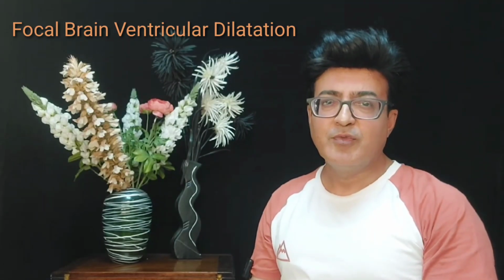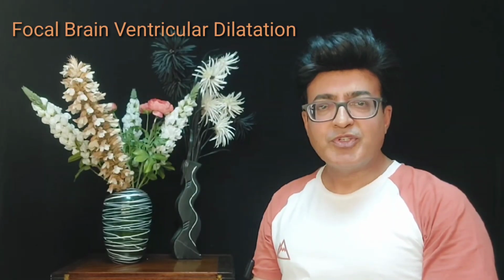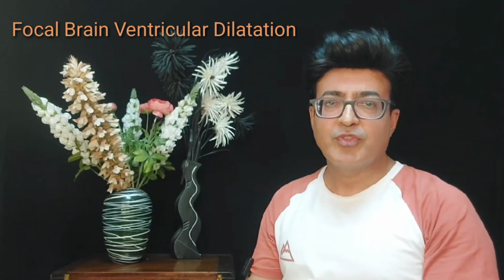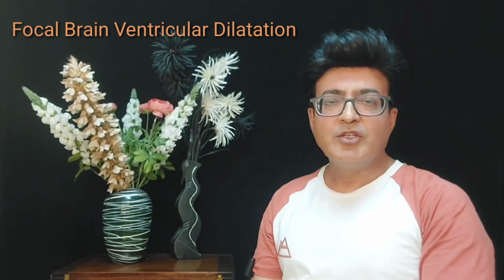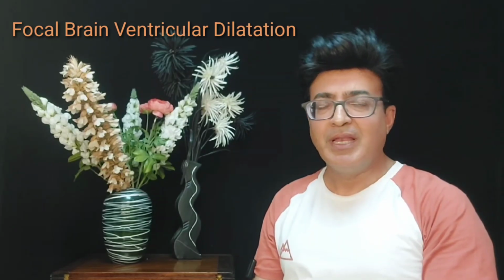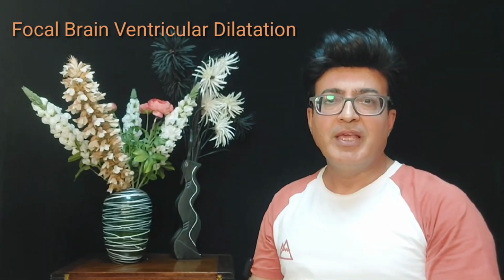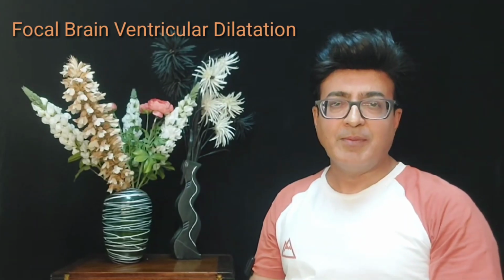In the pediatric setting, obstruction at the level of foramen of Monro or aqueduct stenosis also leads to dilatation of the ventricles. In the adult age group, usually space-occupying lesions or any glioma may lead to ventriculomegaly. What are the differential diagnoses and how does the Evans index play its role towards the diagnosis? Let's look at these images.